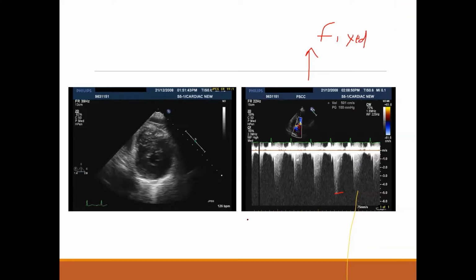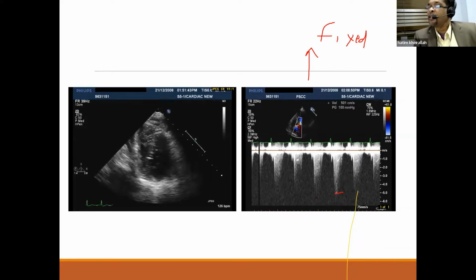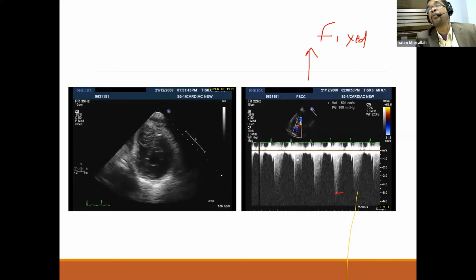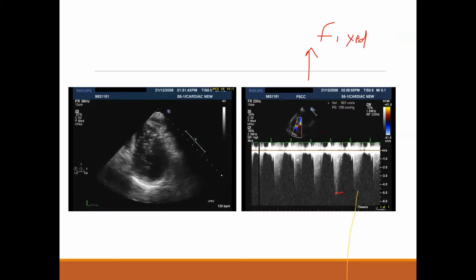Yes. But I have one concern about this signal. I really have to know exactly where it starts and where it ends. It starts very early. Contamination. Yes, I have to make every effort to know exactly, am I tracing the right signal, or am I being contaminated by the MR jet? And that is not uncommon, by the way.